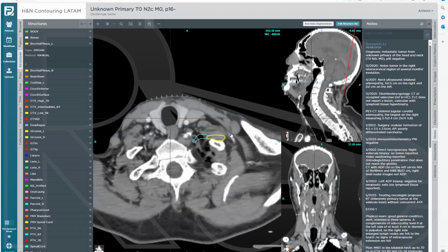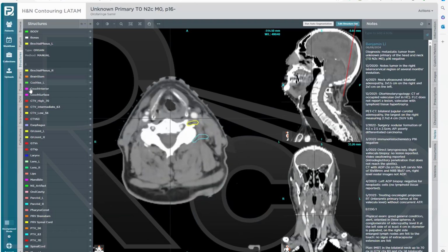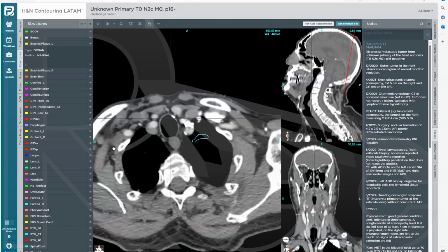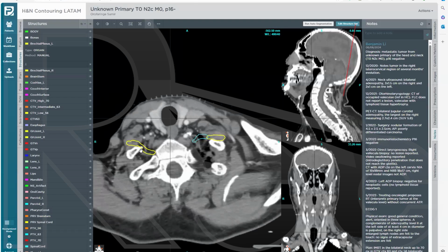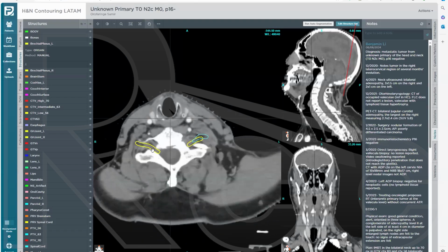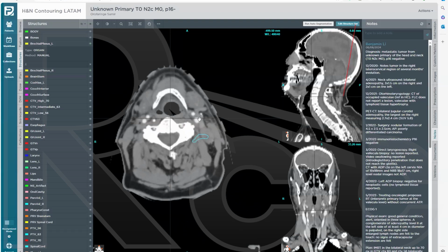So I thought this was actually a nice attempt at drawing the brachial plexus. I mean, just a little adjustment here in T1, but whoever drew this did a pretty good job. Let's look at the right brachial plexus. The same thing here. I like to go a little bit lower down, follow. You have the T1, and then 8, 7, 6, and 5. See, easy peasy. Then you have brachial plexus. You can actually draw it faster than you think.